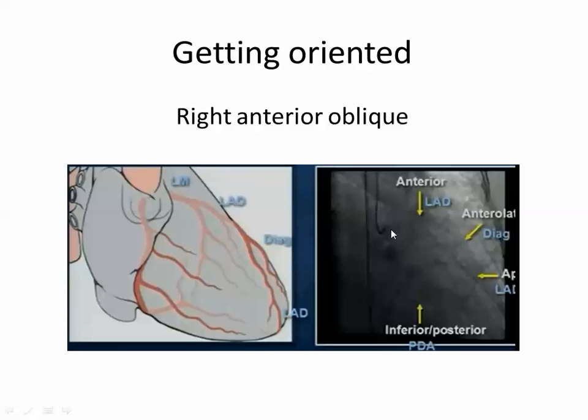And here atrioventricular groove also. And here will be the left atrium. So what's the vessel that comes to the anterior? LAD. What's the vessel that comes to the atrioventricular groove? LCX. If it's dominant, it will give the PDA and supply the inferior. It's so simple. Okay.